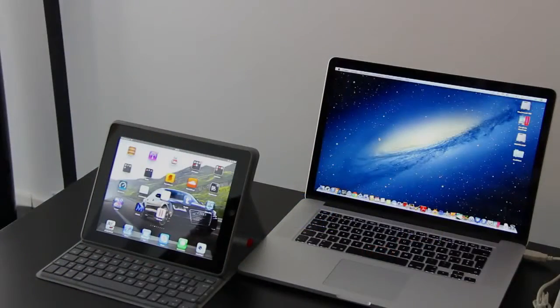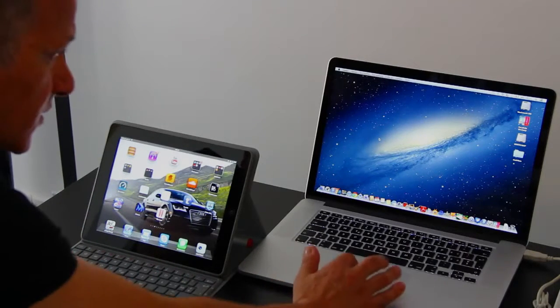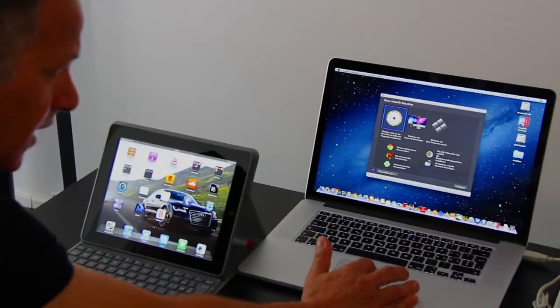So Philip will come closer with the camera so we can actually see how to maneuver through the software to run all these things on an iPad. As I explained before, we will run now the Active 2 on an iPad, which is absolutely phenomenal. First thing we need to do is launch Parallels.